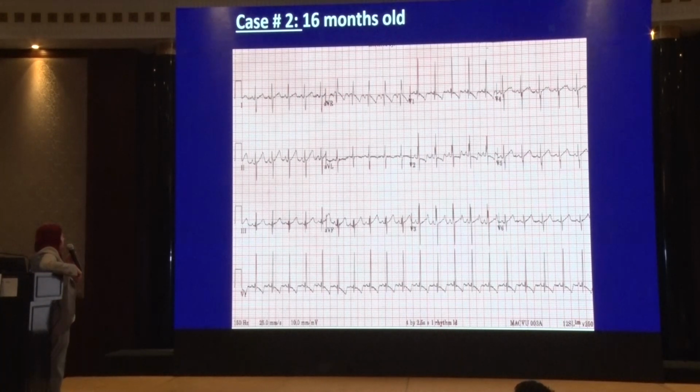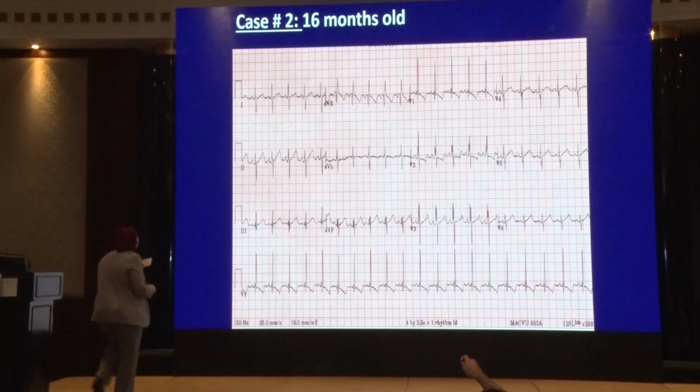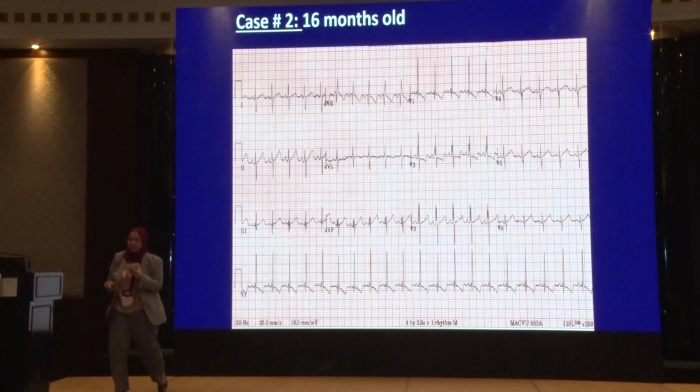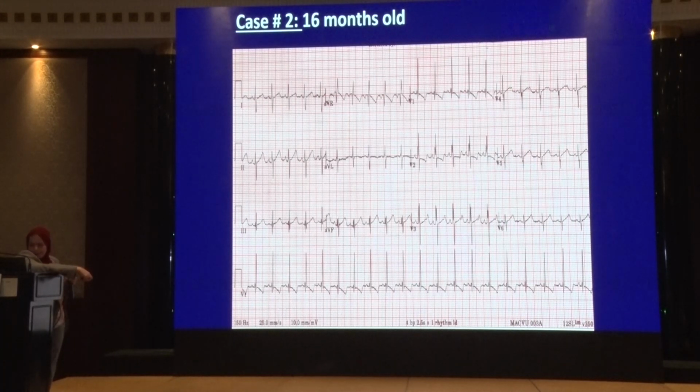Okay, is this patient in sinus rhythm? Where is the P waves? Yeah, they are positive in lead 1 and lead 2, negative in AVR. They have the same morphology in the same lead, and the PR interval is regular. So this patient is in sinus rhythm. Then we will look for Q in lead 3. It's deep, okay?